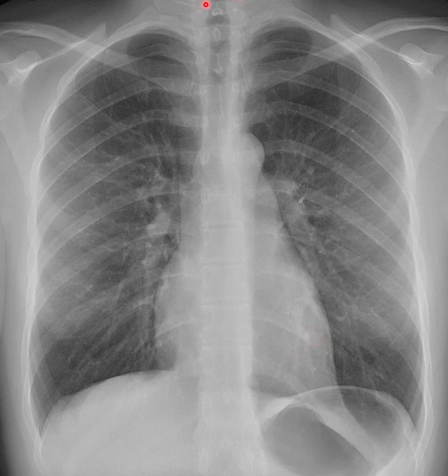So what we do is we start at the top and make sure that we can see the apices of the lungs, which is the most superior part of our lungs. So I go to see the ribs here, the first rib. I look for that first rib, and then I know that I have not clipped any part of the apices of the lungs superiorly. Then I go all the way down to the bottom and make sure that inferiorly we have included the costophrenic angles down here. The right and left costophrenic angles of the lungs are included in this chest x-ray. So I know that I have not clipped any anatomy superiorly or inferiorly.